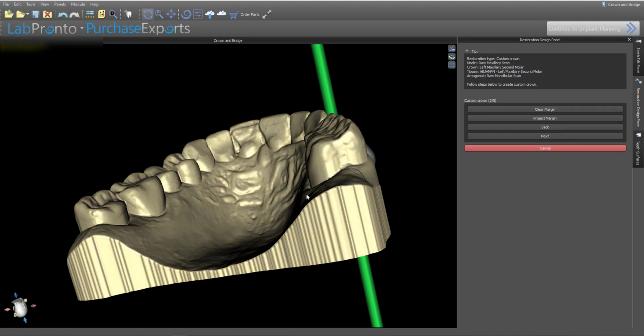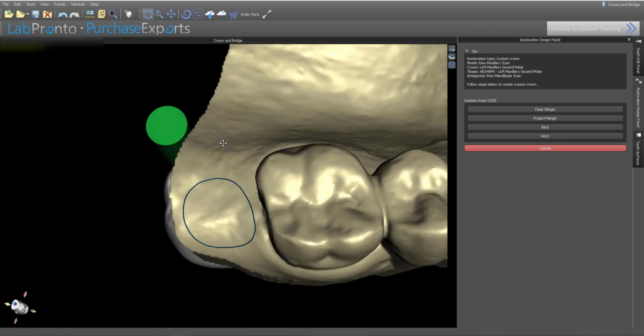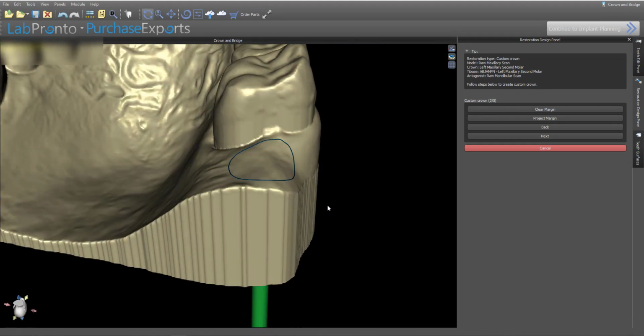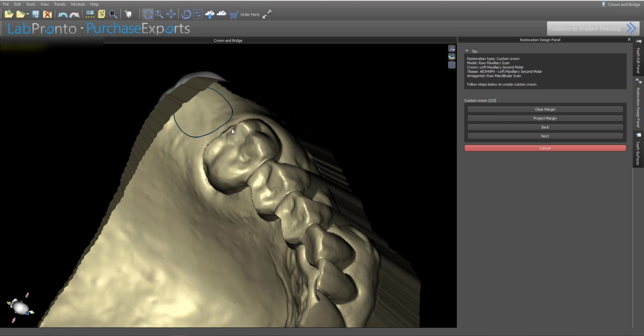Next. And you've still got to design a gingival emergence. That's what it's asking for here. I'm going to just use the same one from earlier, and what it'll do is everything above this gingival model, it's going to warp the crown down to that, and then everything below, underneath here, it's going to warp from this line down to the margin of the tie base.